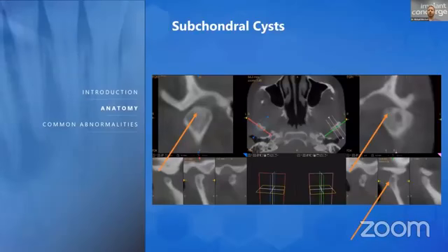Like I wanted to show you, you go from something that's mild to now something way more extreme. Just interruption of the cortical outline, surrounded by sclerosis, no significant osteophyte formation, but now we're leading towards something that is an active degenerative process versus something that's just remodeling.